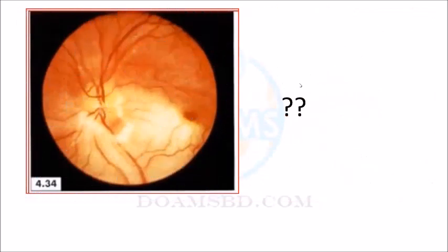So what is the diagnosis? Please try to understand. I hope that you will feel free, altogether, to be interactive. Is there any pale retina, Dr. Mahbub? Is there any pale retina? Yes, sir, part of it is pale. So pale means less vascular, less vascular. Yes, sir.